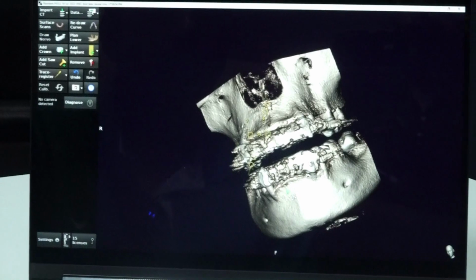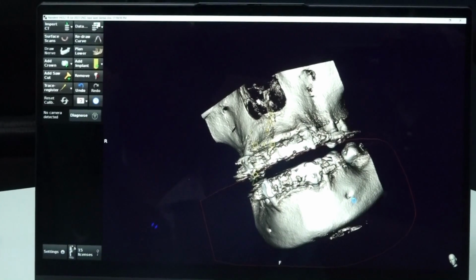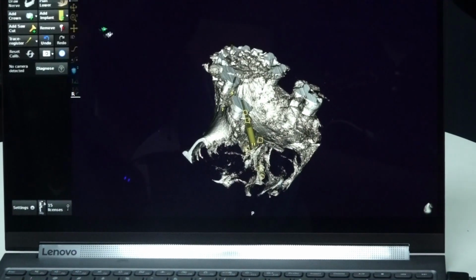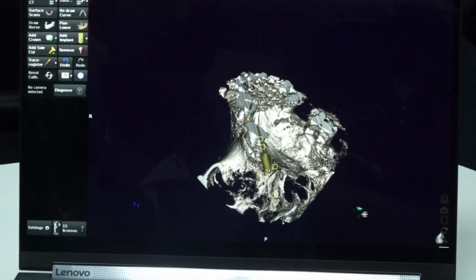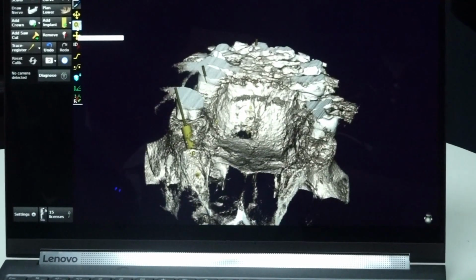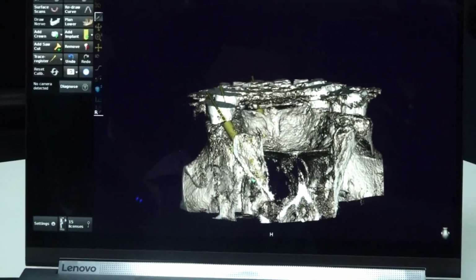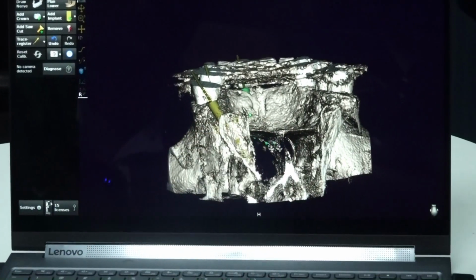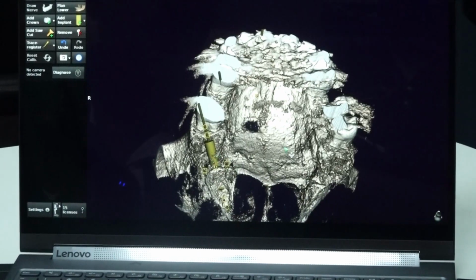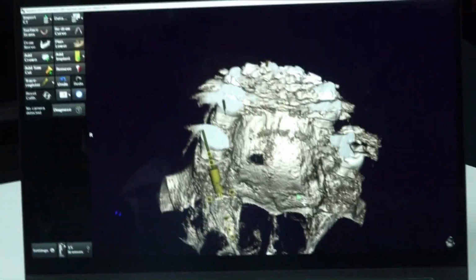So whenever you plan pterygoid or whenever you plan maxilla, better remove the mandibular segment, then only you can see what is happening. See, because of the anterior metal ceramic bridge, there is a lot of artifacts. This is the back side of the pterygoid. You can see, no, this is the pterygoid region, this is the medial pterygoid plate, this is the lateral pterygoid plate, this is the area between these plates, this is our target area, this is the tuberosity. Okay, it enters from buccally, it enters medially and it comes here.